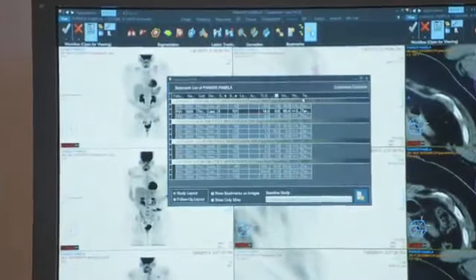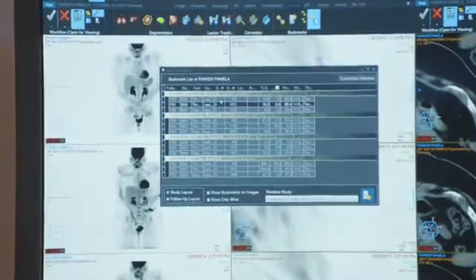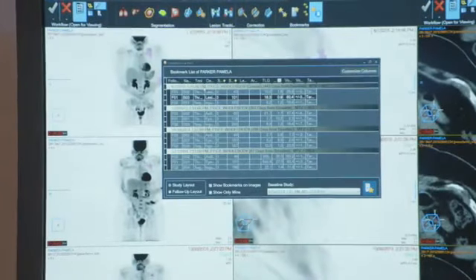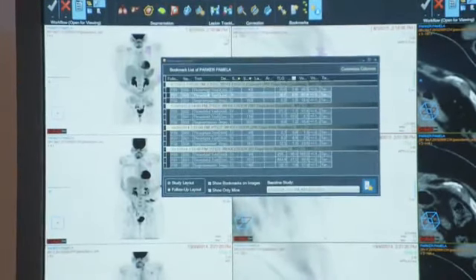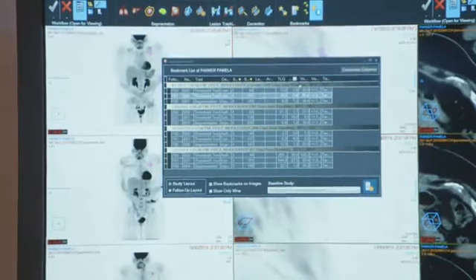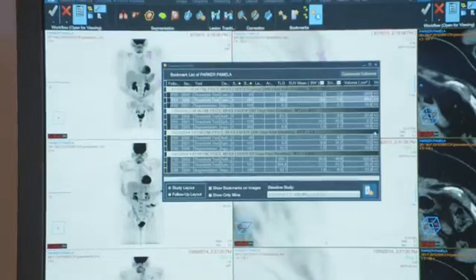So what we did is we segmented over the current study, and now what I want to do is show the bookmark list for this patient. As we can see here, we have 3 new lesions in the study. One is a lymph node, and the others are threshold segmentation tools. And you can see here the SUV values. We have the SUV max value here.